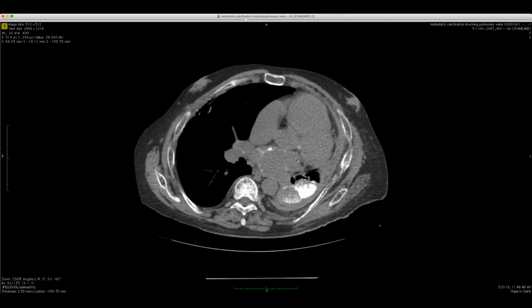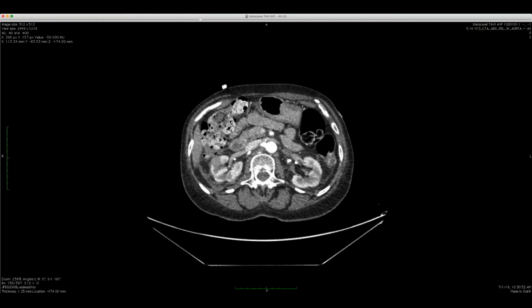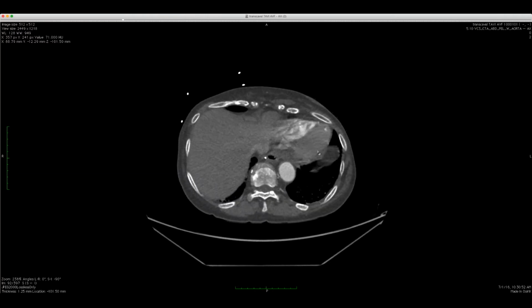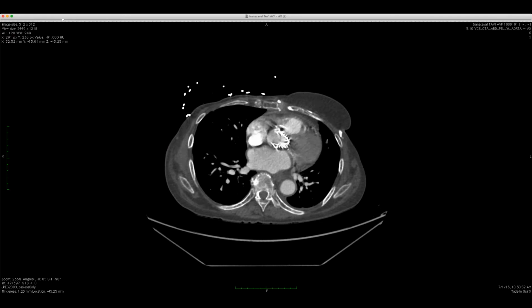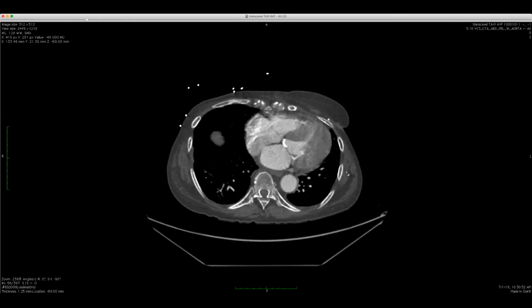Yeah. All right, so now for the good cases. This one, let me switch the screen so you can see this. Okay. This is a patient who had a transcatheter aortic valve implantation, and like some of the patients who do this, there were contraindications to entering via the femoral approach, so this valve had to be placed in an alternative approach.